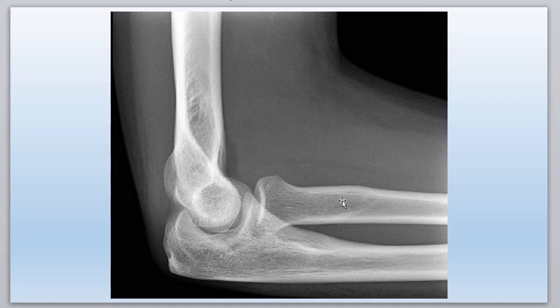For attachment of the bicep tendon, it would attach in there. It's kind of at a weird angle here. It's back in there. Let's see what else you can see. I think we talked about everything else. This is the capitulum here. It's really, really dense bone, so it actually forms its own little markings here on the lateral film.